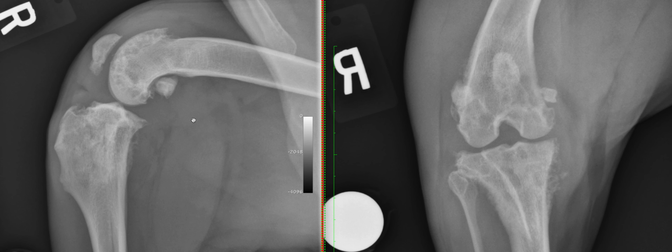cranially. And there is also quite a lot of soft tissue fluid opacity at the caudal aspect of the stifle here that you can see, and quite a severe bulging there, displacing the fascial planes caudally. So this is the first feature of those radiographs.